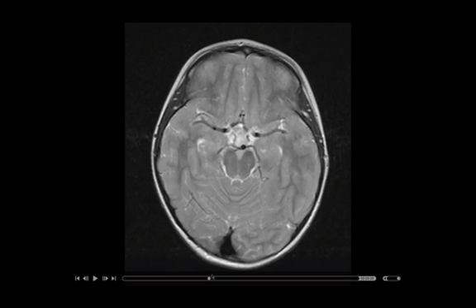Moving on to talk about the lobes in this image, we have the frontal lobe, the occipital lobe, and we're still relatively low, so we're at the temporal lobe, the right temporal lobe here, the left temporal lobe here. Going to move superiorly. Next slide.